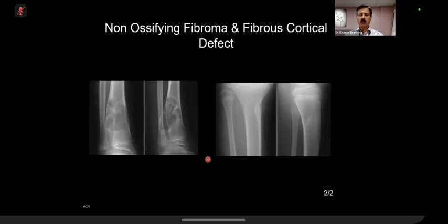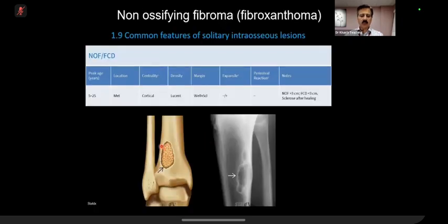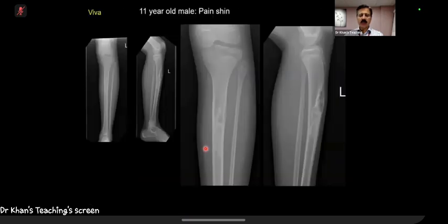And so histologically speaking, we are not concerned. It's not a malignant tumor, but surgery-wise, they do sometimes use cement and implants, etc. for these patients at times. So this is a non-ossifying fibroma. And this is another case.